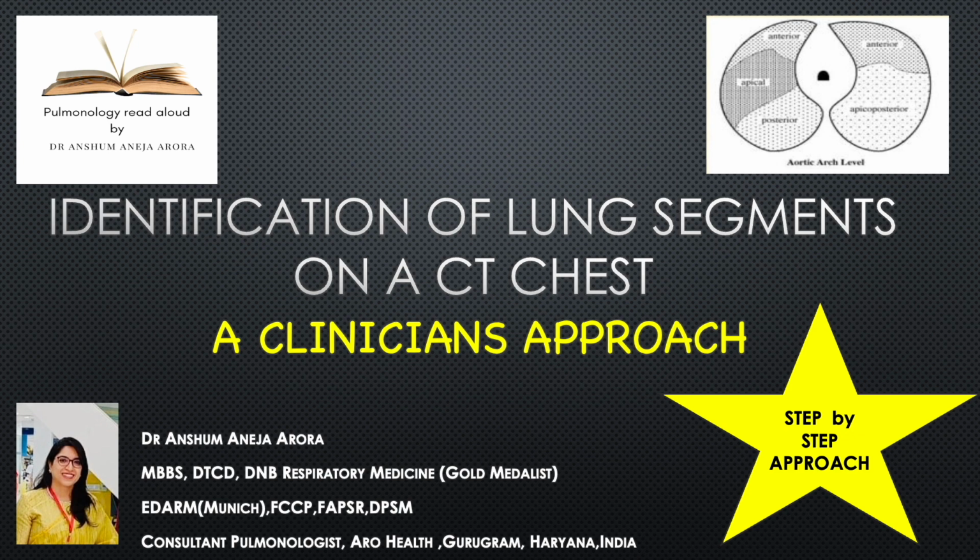This video is based on your request for a specific video on how to read the lung segments on a CT chest. Since I am not a radiologist but a practicing clinician, this is a clinician's approach to how you can find out which segments are involved, which lobes are involved to guide your therapeutic procedures, diagnostic procedures and therapeutic interventions. So let's get started.